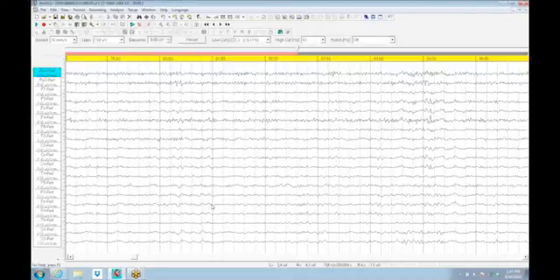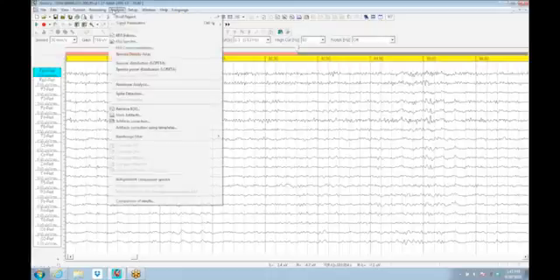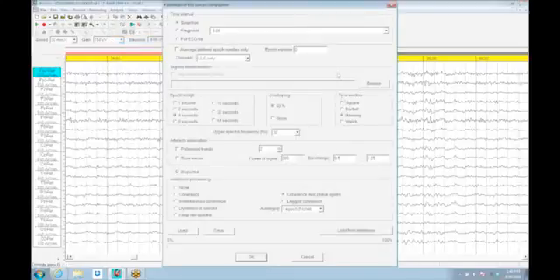If you have an amplifier hooked up to it, it does all sorts of normal amplifier things like running calibrations, checking impedances, and all that. But if you use it as standalone analytic software, you can see it's actually quite powerful. If you do have the dongle and you go to your EEG spectrum here, you can end up getting norms from the database as well.